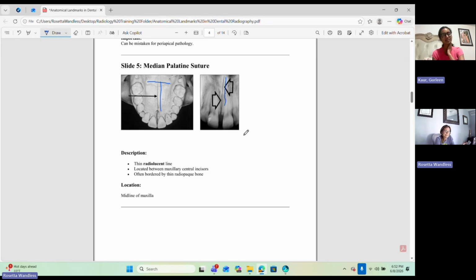Now you're going to look at it and go, oh, look at this huge space between these two incisors. Why? It never sutured. Can you make it suture? Absolutely: braces, ortho, surgical closures. I'm just stating that because if your x-ray is too dark or too light, the doctor isn't ever going to see that and see if there's an issue, or if it's supposed to be here, or if we need to do something. Does that make sense?